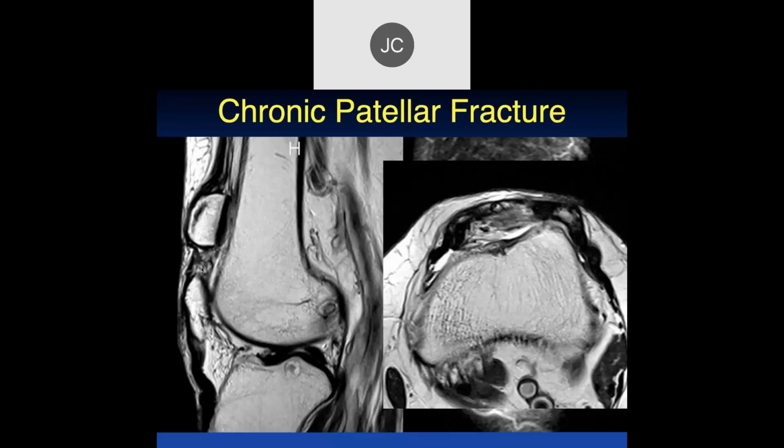And I assume, John, you'd take out the inferior one and reattach the patellar tendon? That's the way I would do it. Okay, yeah. And you might have to give it more length by doing a Z-plasty of the quadriceps tendon to lengthen it. It looks like it's probably chronically retracted. But the distal one has to be removed. Okay.